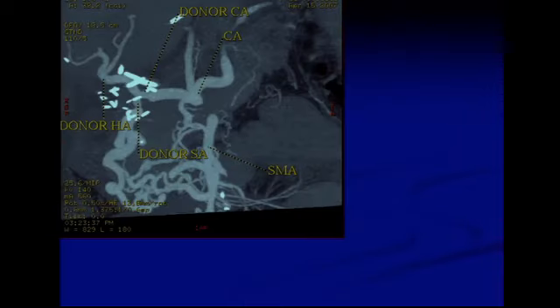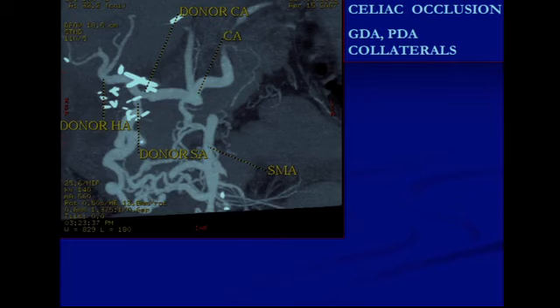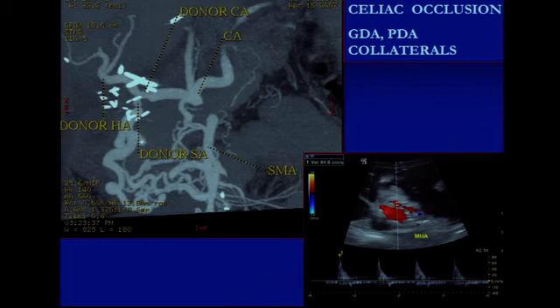This is a situation where the patient had the celiac artery of the recipient occluded at its origin with a profuse collateral circulation through the gastroduodenal artery circuit. So what the surgeons did in this case was to take the donor splenic artery, anastomose that to the gastroduodenal artery, anastomose the donor celiac artery to the recipient's common hepatic artery, and then we see the donor hepatic artery branching into both the left and right intrahepatic branches. So just an example of surgical ingenuity in a patient with a celiac artery occlusion. And this patient's hepatic artery waveform in the early postoperative period looked normal.